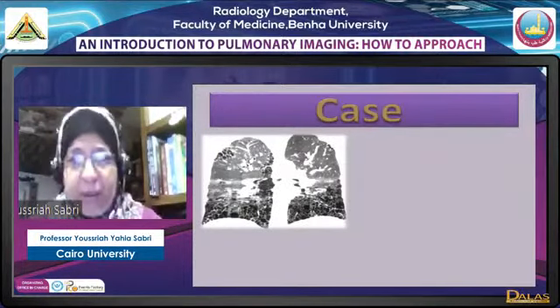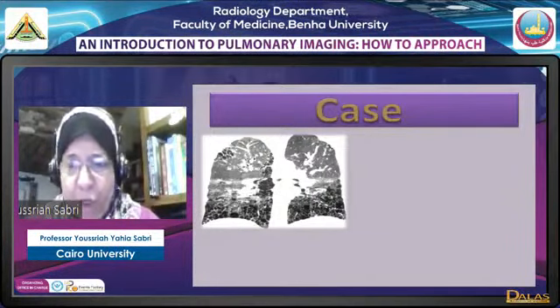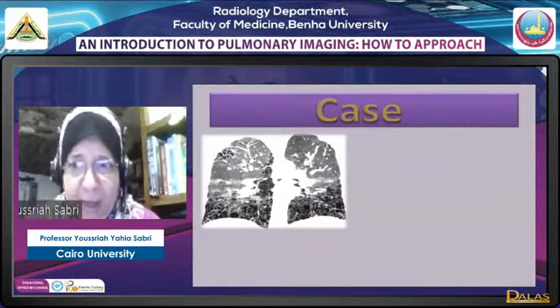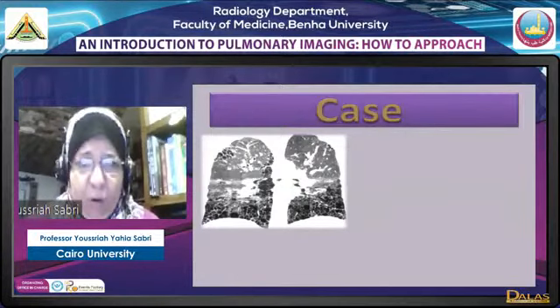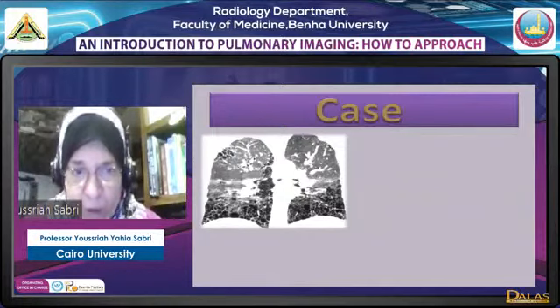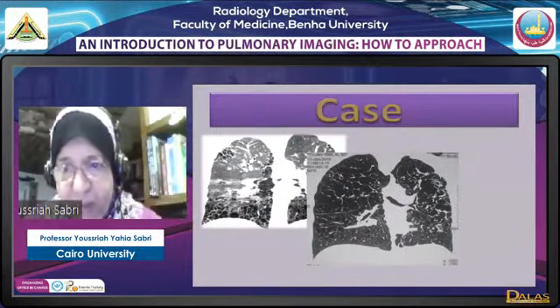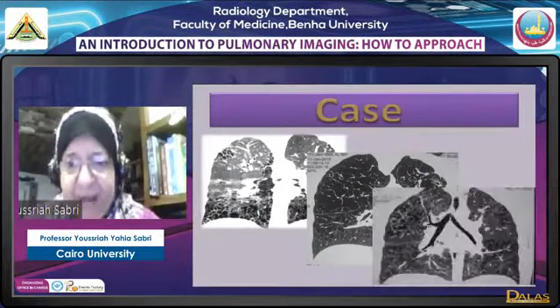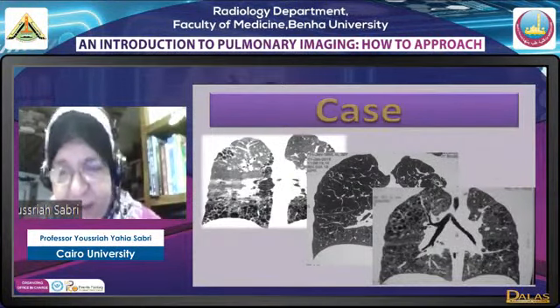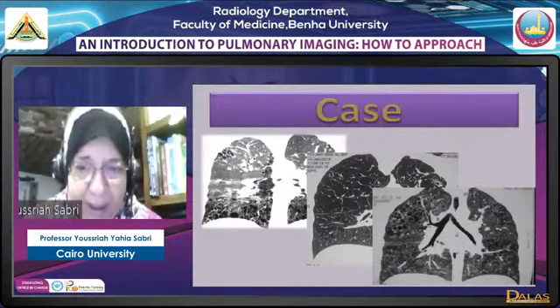Now coming again to the cysts. So we have finished with dots, macronodules, we have finished with strands, prominent inter and intralobular interstitium. We have finished with the classic distribution of some patterns of ground glass. Okay, now going back to cysts again, we have the classic subpleural predominant clusters of cysts in honeycombing, and the classic upper lobar bizarre shapes of pulmonary Langerhans, and the classic diffuse cysts in both lungs with an otherwise normal lung in females with LAM.